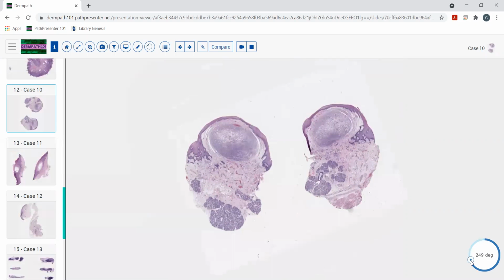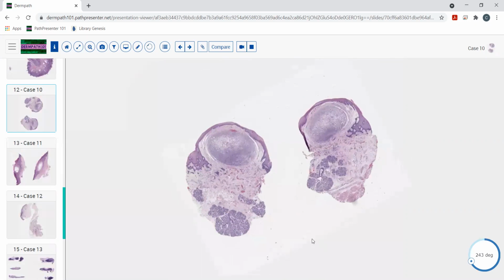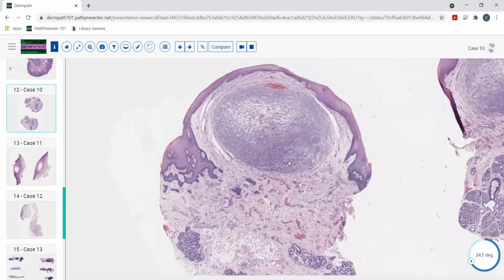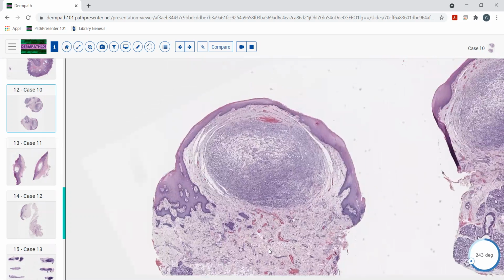Okay, next, this lesion probably does originally come from a cyst, but when we see it, we almost never really see the cyst. Okay, and so when you see a biopsy like this, well, what part of the body are we on?